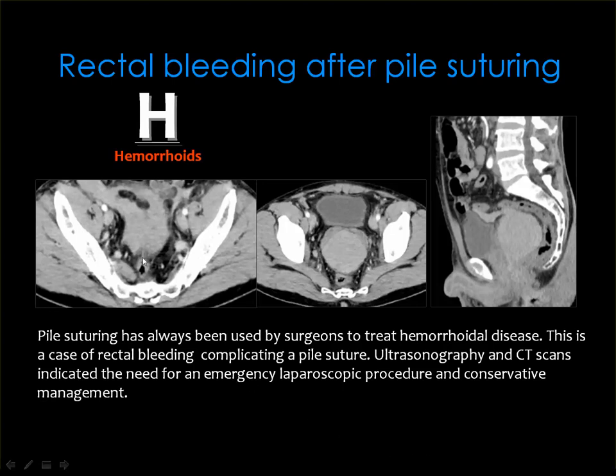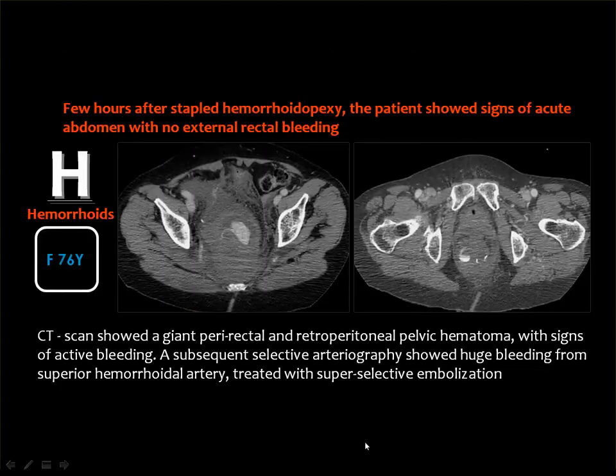And this is another rectal bleeding after a hemorrhoid surgery. You see the blood filling most of the rectal cavity. And this is also a bleeding after hemorrhoid surgery.